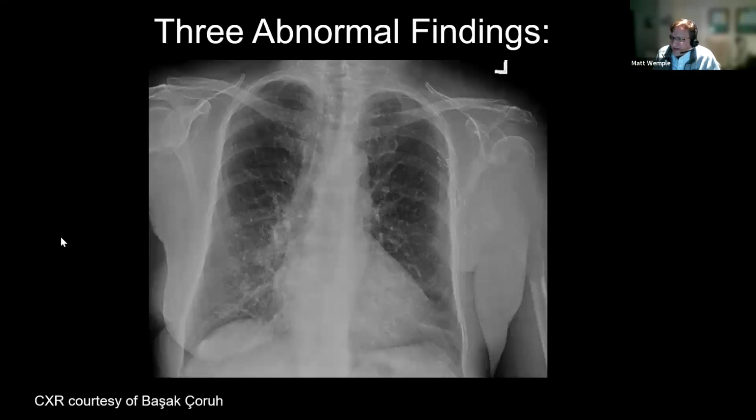Okay, so 3 abnormal findings in this film. Can someone spot, or I'll give everyone about 10 seconds to see if they can find abnormalities in this film.